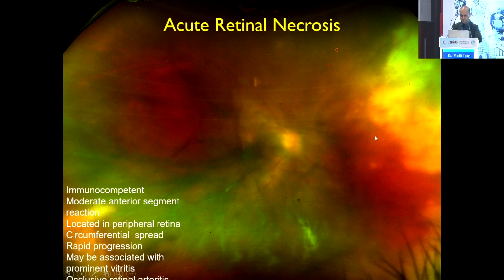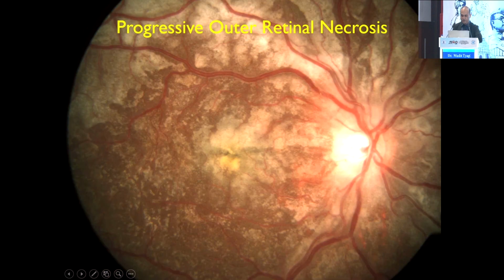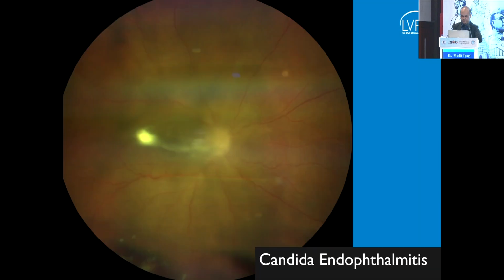Thank you so much. So acute retinal necrosis, another common clinical pattern. You see this extensive confluent peripheral retinitis. That is a clue to an acute retinal necrosis. In patients who are systemically, severely immunosuppressed, if you see this mud crack sort of an appearance with retinitis and occasional perivascular sparing, that's a clue to a progressive outer retinal necrosis, which happens in significantly immunosuppressed individuals.